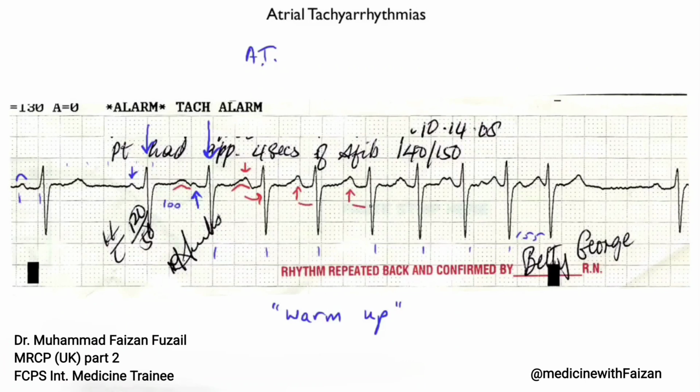So there are P waves preceding each beat, and it starts to get interesting as you get to the end of the tachycardia. Where are these P waves? Well, I think it's clear that there's one here. But now what happens is there are two bumps. Now, which is the P and which is the T wave? You would expect that maybe this is the P because it's in front of the QRS complex. But remember, we have a PR interval that's somewhere between 180 to 200 millisecond range. So if you measure back from this QRS complex, you'll see that this is probably the P wave.